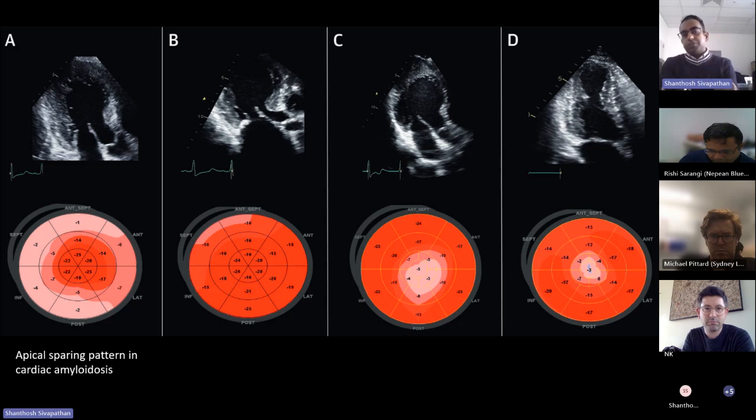So if you see this, and it's quite specific, to be honest, I would really question whether this patient has cardiac amyloid and then go back and so forth. Just as a side note, if you had the opposite, where it was all blue on top and kind of pink everywhere else, so it's known as a blueberry on top, has anyone come across that term? No.